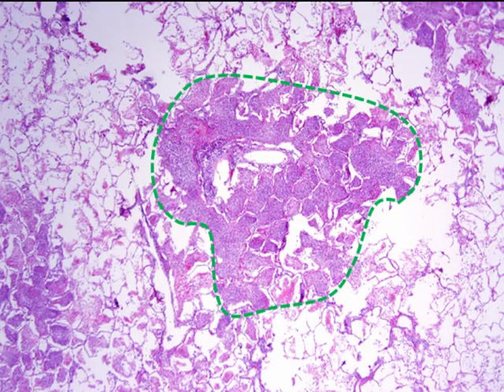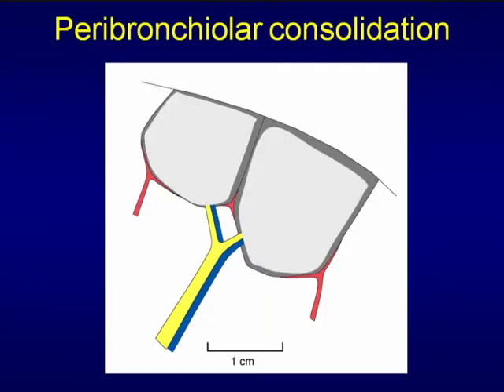Here is what those nodules represent. You have impaction and you have consolidation. You have confluent alveolar disease centered upon the bronchiole, the central lobular bronchiole. And that's why these nodules tend to look much denser than what's more commonly the interstitial inflammation of the first pattern, typical of things like HP. So consolidation begins here, but it doesn't end there if it's not treated appropriately or the immune system doesn't handle it, and it eventually fills up that entire pulmonary lobule and produces areas of more confluent consolidation.